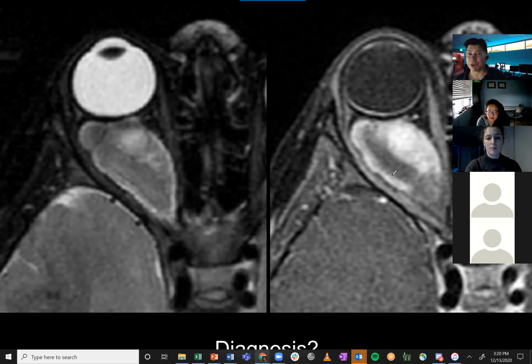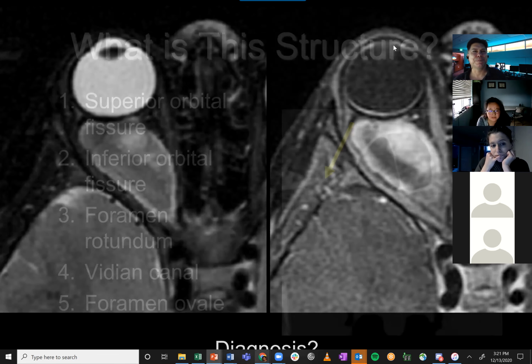Yeah, great appearance for optic nerve glioma. The whole tumor is big. You can actually see the rectus muscles kind of going around it, and the soft tissues right next to it don't look very angry about this thing. So what do you think about an optic nerve glioma happening in the second cranial nerve? Do you see gliomas in the other cranial nerves? No, you don't. Why not? Because this is like an extension of the CNS. It's like CNS stuff, right? So yeah. Cranial nerve 2, we get all these other pathologies within it. Good. Okay, next case.